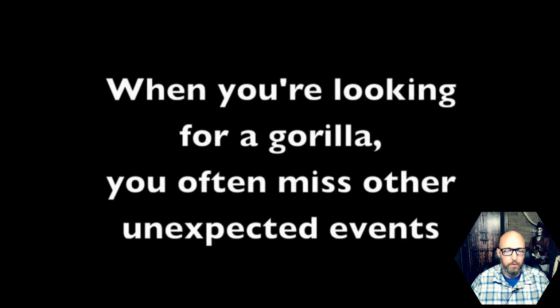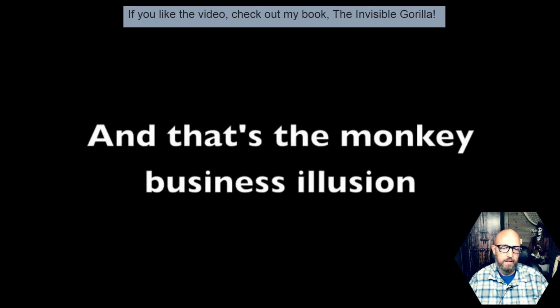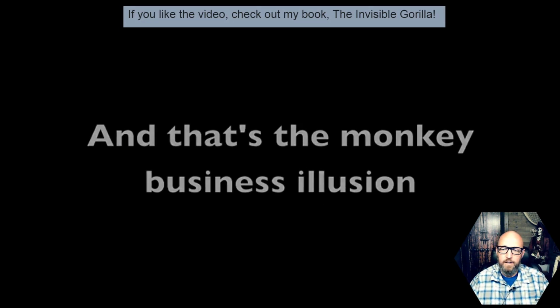So hopefully at least some of you watching this got surprised by that. You often miss other unexpected events. What's the point of that in talking about radiology? That's the monkey business illusion. We're talking about attention to detail when you're looking at images, particularly looking at cone beam CTs, 3D imaging. Always think of that as more like watching a movie than looking at an individual image. But even in intraoral radiographs, I see dentists miss things all the time because they're looking at one individual tooth. Maybe they'll look at a couple teeth, and they won't look at everything outside the field of view.